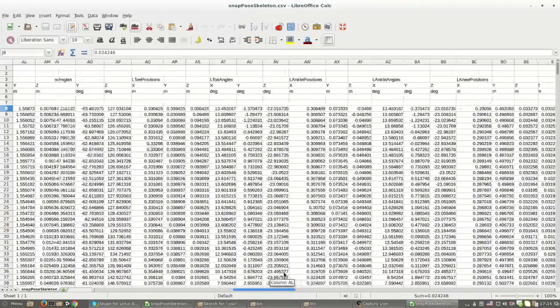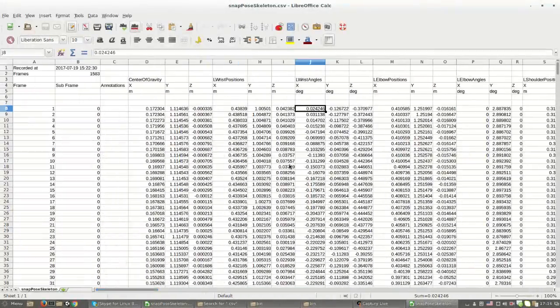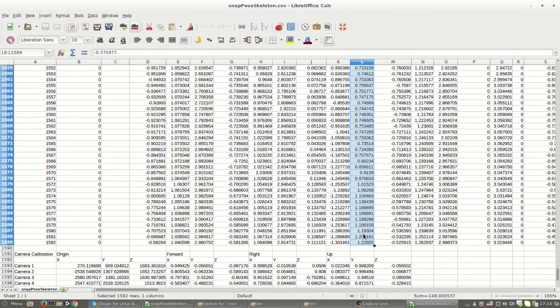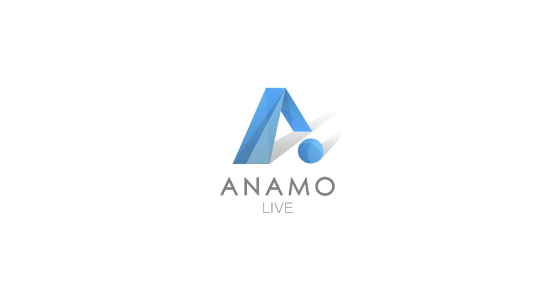These work as very handy ways of detecting an injury, or else if somebody has been injured and they're rehabbing an injury, you'll be able to get the results side by side and actually compare and contrast them, which will help you greatly with your diagnosis.